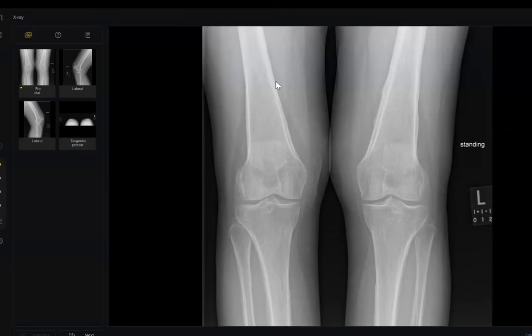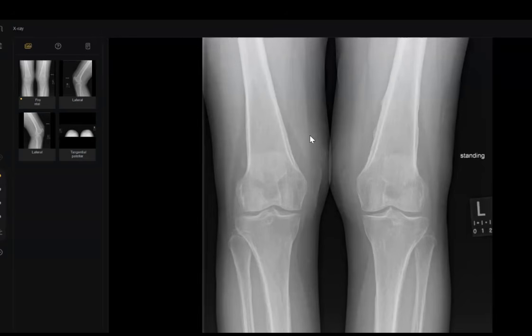I can see that there is diffuse generalized osteopenia in keeping with the patient's age. However, there is bilateral symmetrical periosteal reaction in the long bones, predominantly involving the fibula, proximal tibia, and the distal femora. No soft tissue component is seen. Mild degenerative changes are noted. There is no acute traumatic injury. And I would like to see lateral views as well to see any joint effusion, etc.